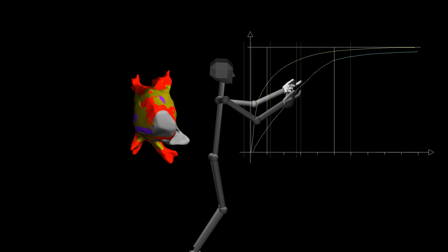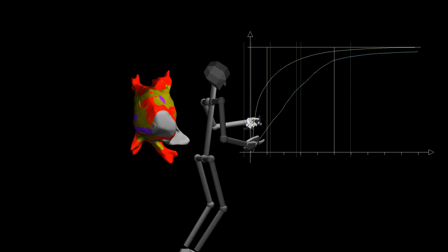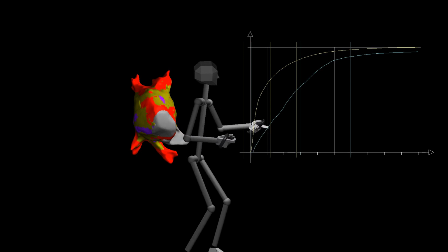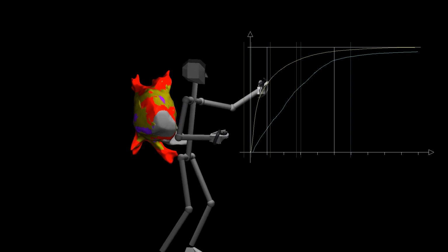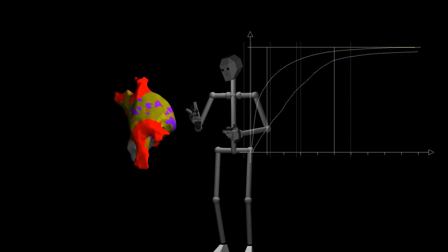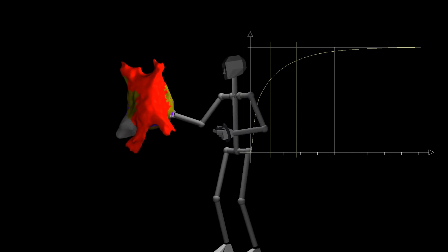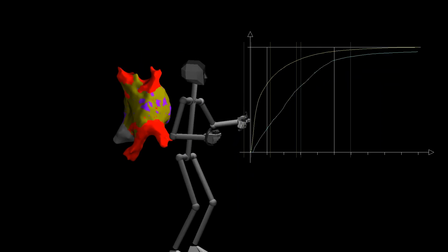Specifically, what you're seeing is that all of the voltages are pushed towards the left side. We are noticing that now, instead of having 20% of the surface with voltages of 0.1 or less, we now have, I'm going to say, somewhere between 60 and 70% of the surface having voltages below 0.1, meaning that we're going to see a lot more red than we did before. If I turn off the pre-voltage mesh, then we can see that this side of the heart is almost completely red.